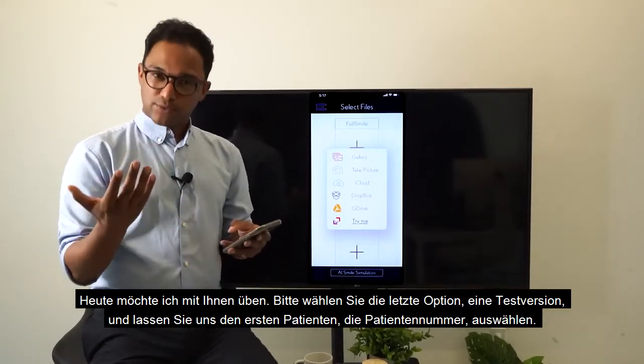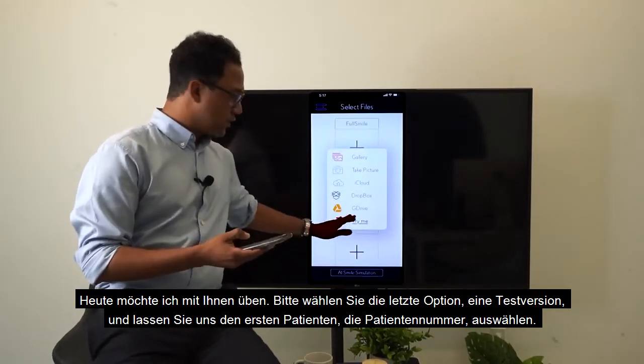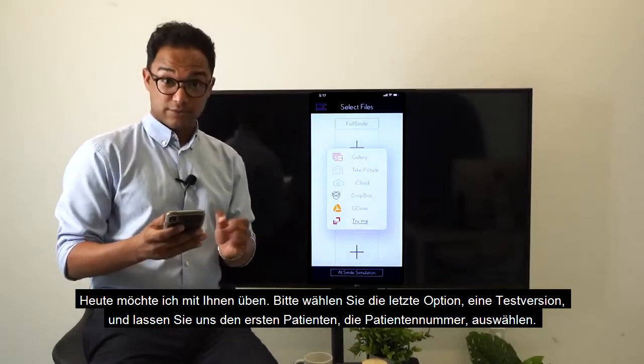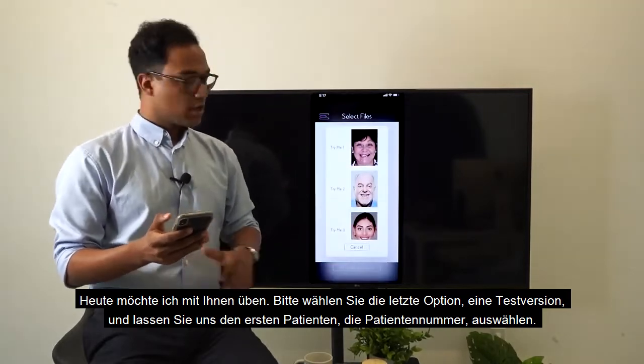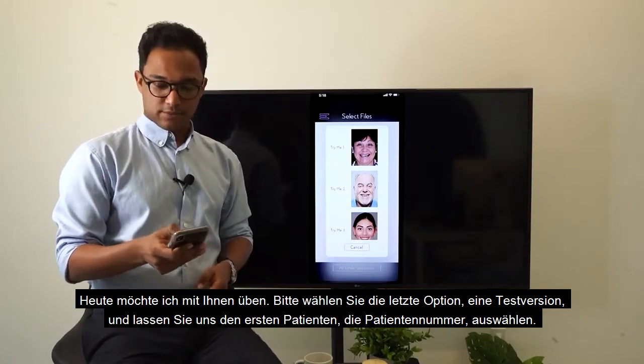Today, I want to practice with you. So select the last option, which is the Try Me version. And let's select the first patient, patient number 1.